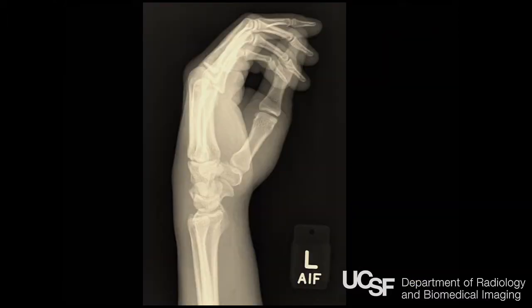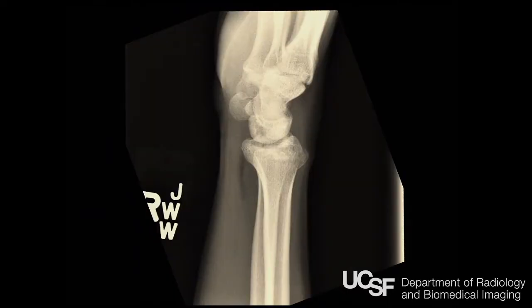Other findings that we can use, secondary findings, are soft tissue swelling. So look at your lateral radiographs for the soft tissue swelling. Look where it is. Is it over the metacarpals? Is it over the distal radius? Also look at the pronator fat pad, which is right here. There's usually a nice straight black line here, the pronator quadratus fat pad. And if it's gone or bowed, that's a suggestion that there's something wrong there, edema or hemorrhage. And there may be an occult fracture, usually distal radius, perhaps the scaphoid. But that's a good sign to clue you in that there's something wrong, and don't just blow it off. There should always be a fat pad there.